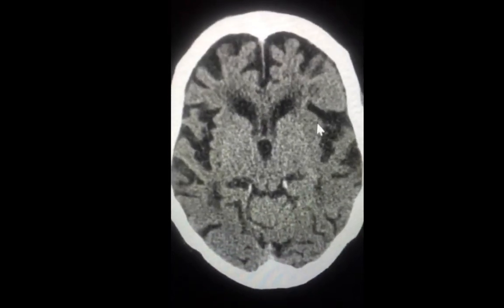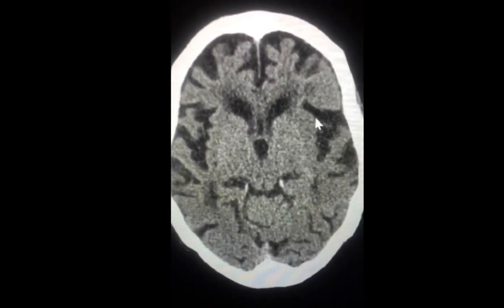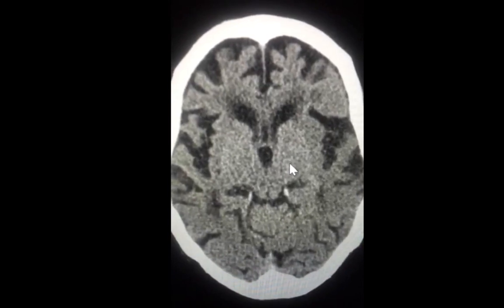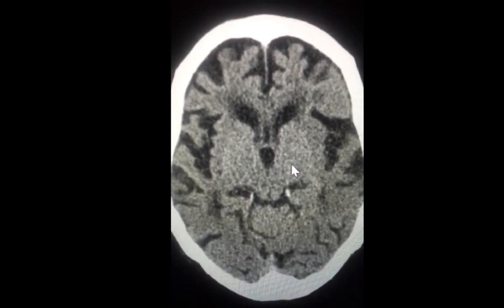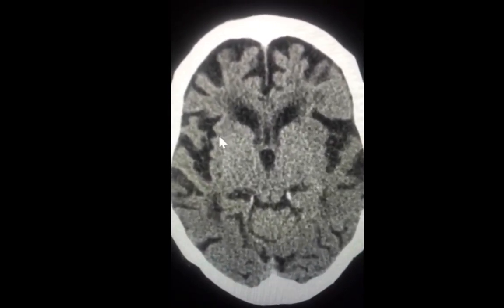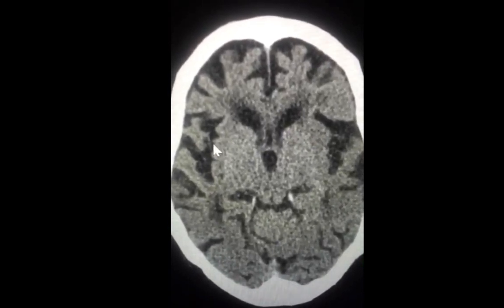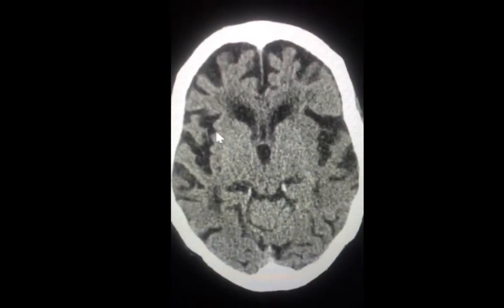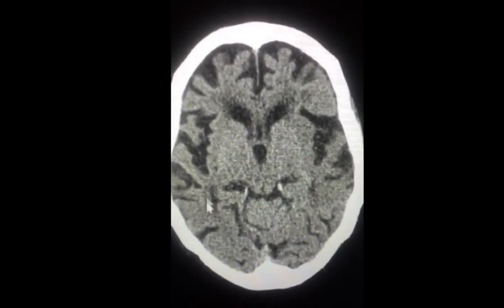The ribbon sign is well appreciated on the left side, where you cannot differentiate between the cortex and the white matter. Remember that with infarction you have associated edema. Edema on a CT brain may appear as hypodensity or signs of mass effect. Knowing that, notice how the right-sided normal insular ribbon has very clearly seen sulci and gyri. By the sulci, we mean these interdigitations of CSF between the brain tissue, very similar to what you see here.